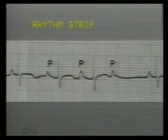After studying the PQRST pattern, we shall study the rhythm strip, calculate the rate, and inspect grossly for arrhythmias. First, see whether normal P waves are present. Study the P wave and PR interval, whether the PR interval is increased, whether it is constant in all the beats, and whether every P wave is followed by QRS complex.